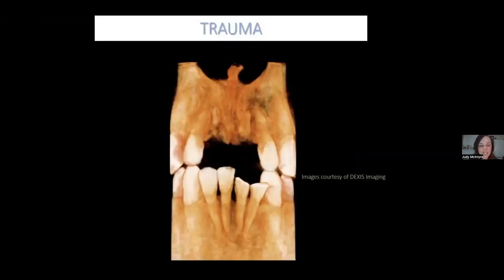Now, historically, the IADT, the International Association of Dental Traumatology, has recommended angled films. So the patient comes in, for example, in this case, with crown fractures on the mandible, and we would take parallel films, 30 degrees up, 30 degrees down, both on the maxilla and the mandible. And that would be informative, right? It would tell us that there's roots retained in the maxilla. It would tell us that there's crown fractures here.